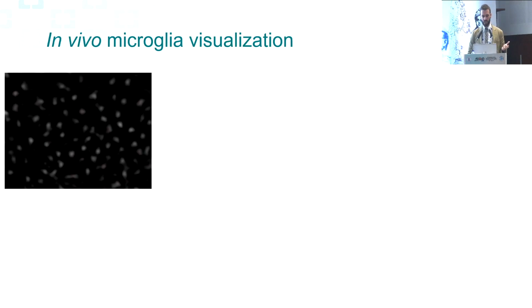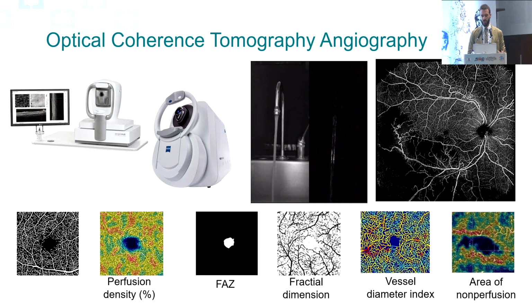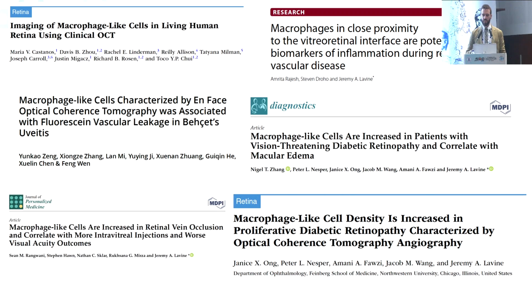Now, how was this picture taken? Was it taken with some fancy electron microscopy thingy? No, it was simply taken with an OCT. In particular, OCTA and en face OCT. Now, these are all parameters of OCTA that we don't really use in clinic, but the medical retina people, as Dr. Vishali said, they're driving our research, they looked at these macrophage-like cells for some time.